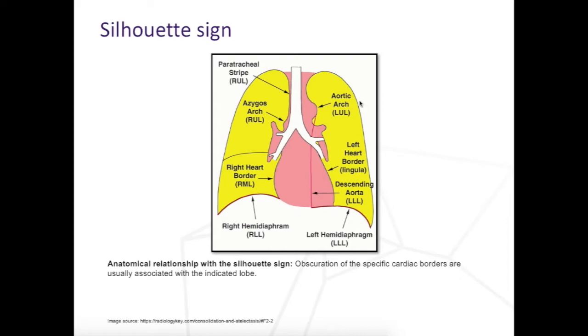Similarly, the left upper lobe, if that collapses, it often gets pulled towards the aortic knuckle here. The lingula or the left lower lobe can get pulled as well, obviously, and it gets pulled towards the heart. But because it's mainly attached at the posterior border, it might appear as if the patient has an enlarged aorta.